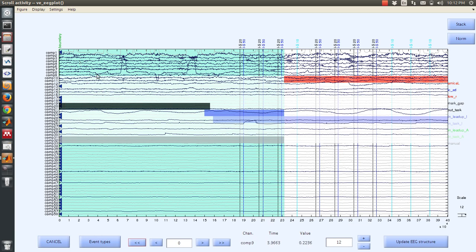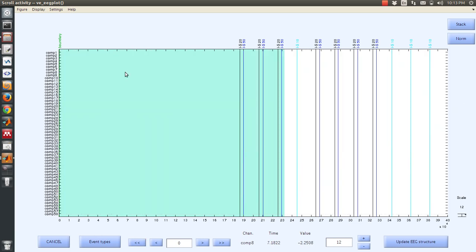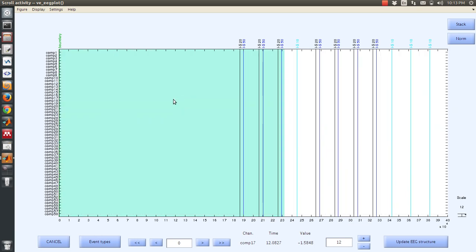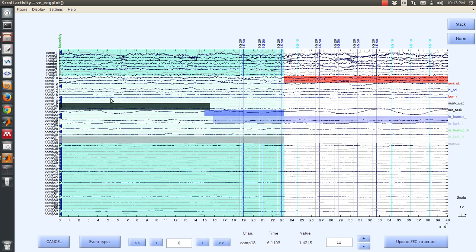Now, clearly it missed some, so there are lateral eye movements that sometimes generate perfectly good dipoles. So the dipole criteria wouldn't catch that, but by right-clicking on it, we can flag it for rejection here. And likewise, sometimes there are perfectly good cortical components that don't have a good dipole fit, so we can invert those back. Even though this one doesn't have a good dipole fit, we can remove the flag for rejection.